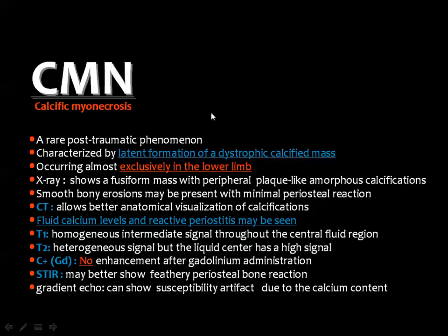Finally, we came to the calcific myonecrosis, which is a rare post-traumatic complication characterized by latent formation of dystrophic calcified mass in the affected muscle.